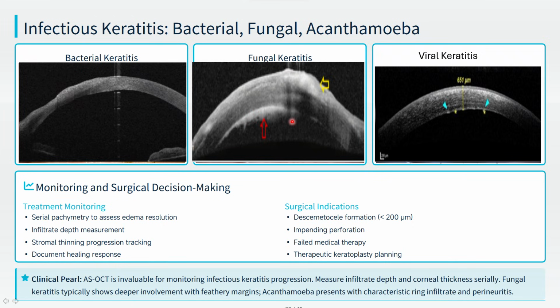So finally, as I said, there is no diagnostic picture by OCT for each organism, but there are some points in favor of viral, fungal, or bacterial, and the most important is the monitoring and follow-up of your case using the anterior segment OCT.